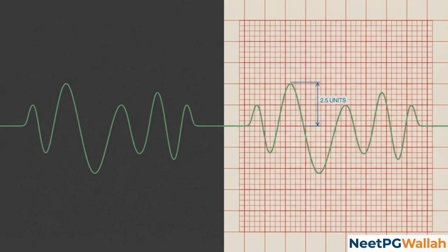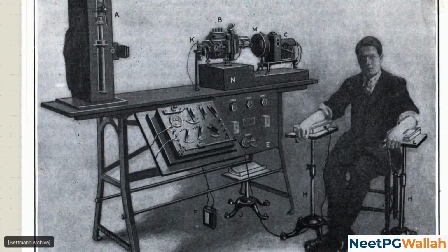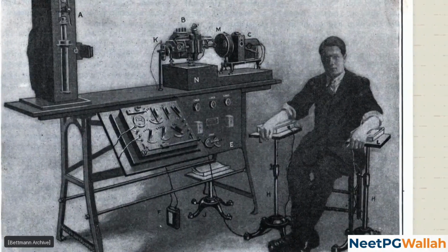This process replaces the initial confusion of seeing these lines with a structured step-by-step analysis. Even a century ago, when ECG machines were massive desk-sized devices requiring saltwater baths, these same geometric principles were used to interpret the heart's activity.